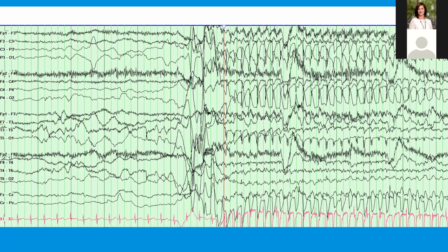That's why having the video is very important. If you have the video open, you can see it. Originally I was going to show you the video, but I'm having some difficulty. It was on my other computer, so I couldn't show you guys. All right, great. So this is just an artifact. Again, this looks almost exactly like a seizure, right? But the only difference is the amplitude is way too high, and you can see it in the EKG. Down here is the EKG.